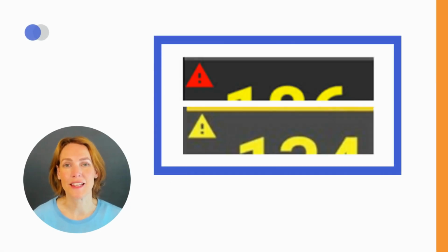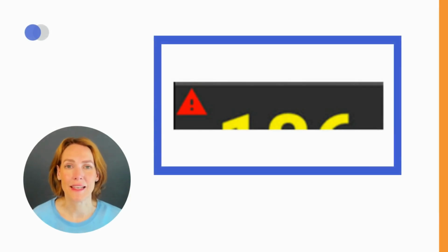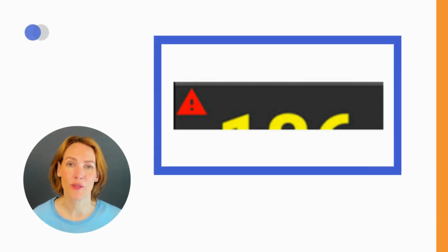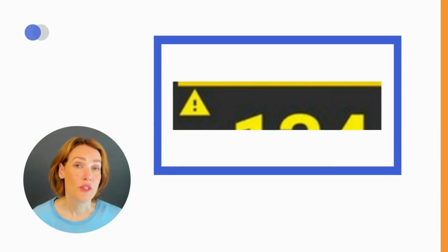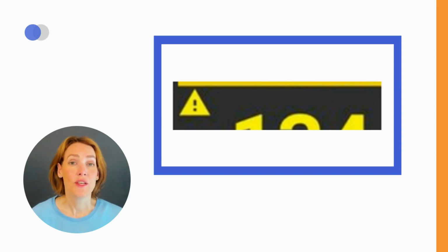Red and yellow triangles indicate sensor data import issues. A red triangle indicates a critical issue where duplicate sensor values are being received, such as from both xDrip and NightScout. This must be resolved before the automated insulin delivery functionality can be re-enabled. A yellow triangle is a warning signifying that some sensor values are missing. This can occur when using a Libre sensor in combination with other sensor-related problems. Unless it occurs alongside other significant issues, this warning can generally be ignored.